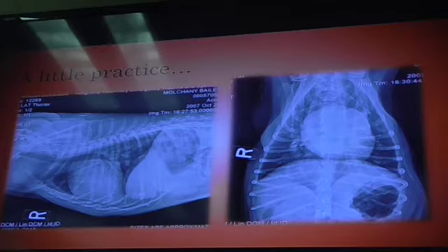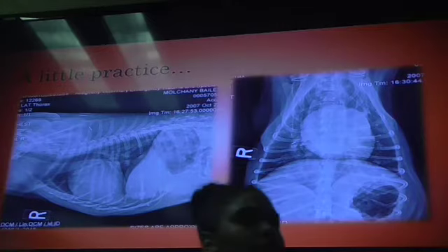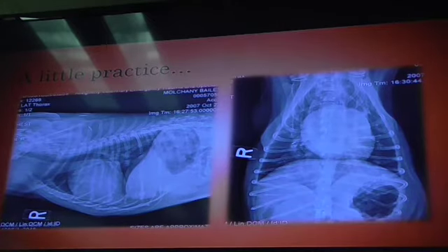Yes. Somebody tell me why. What did they use first? The intercostal spaces. Perfect. How many did you get? About 3 to 4. All right. What else did you guys notice on that lateral? Increased sternal contact. Okay.